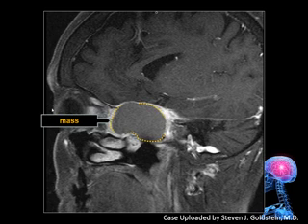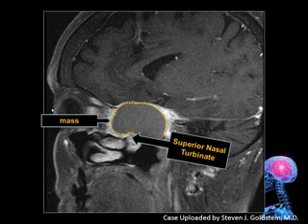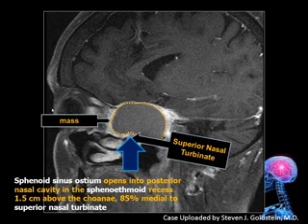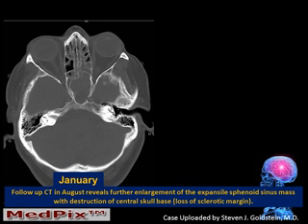On the sagittal image, we can see the mass, homogeneous fluid signal. We can see the inferior, the middle, and the superior nasal turbinate. And just as a reminder, this is the location for the sphenoid sinus ostium, just medial to the superior nasal turbinate. Our patient has now a new afferent pupillary defect in the left eye.